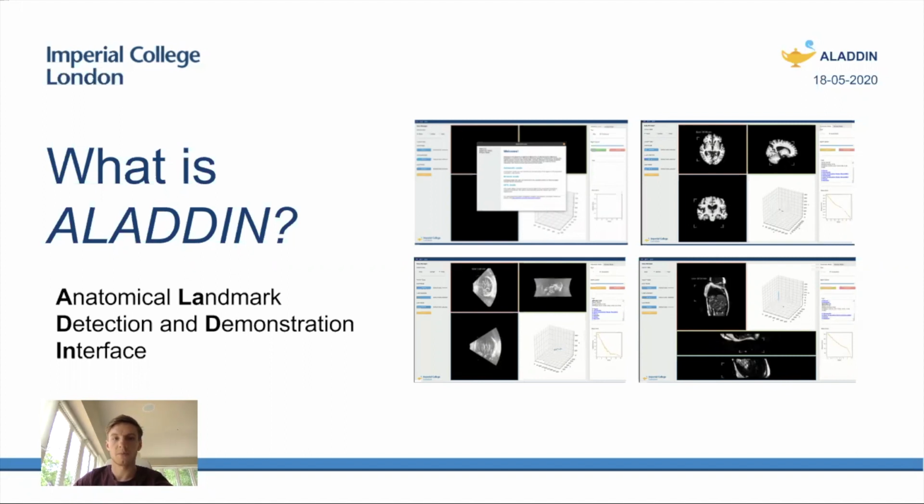Our presentation will begin with an outline of the problem we are trying to solve and our motivations for doing so. This will be followed by a brief overview of the software engineering techniques pursued by the team. We will then provide a demonstration of ALADDIN in action and talk through the various features of the GUI, as well as technical details of our implementation. This will be followed by a section on human-in-the-loop reinforcement learning. This will include the theory and our motivations for using it, details and a demonstration of our implementation, and then results of our human-in-the-loop experiments. Our presentation will conclude with a discussion of our use of transfer learning and the results of our different experiments.